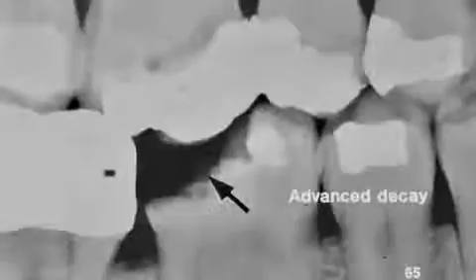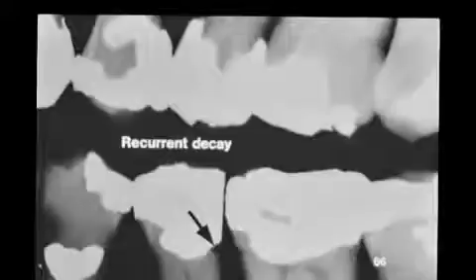Above number 30 is tooth number 3. Can you see the radiolucency next to the opacity of the restoration? Recurrent caries are next to an existing restoration. This is tooth number 20. The arrow points to the recurrent caries. On tooth 21, there's a class 5 cervical restoration with recurrent caries around that. Above, tooth number 11 on the distal, 12 on the distal, tooth 13, distal, cervical, mesial, there are recurrent caries also.